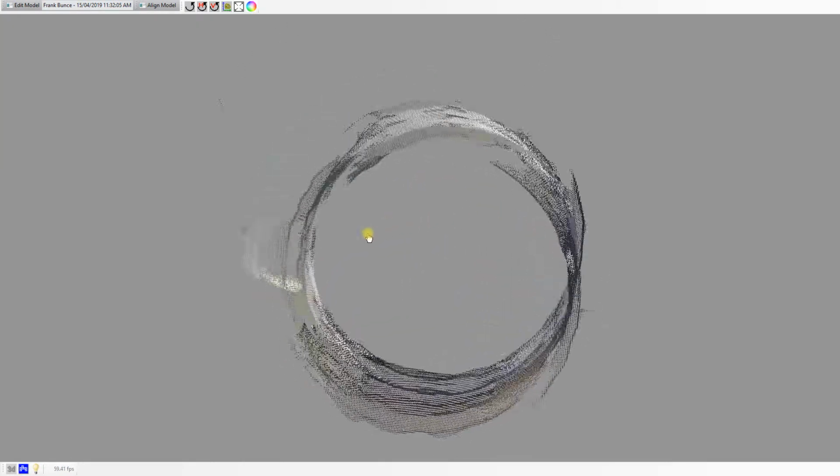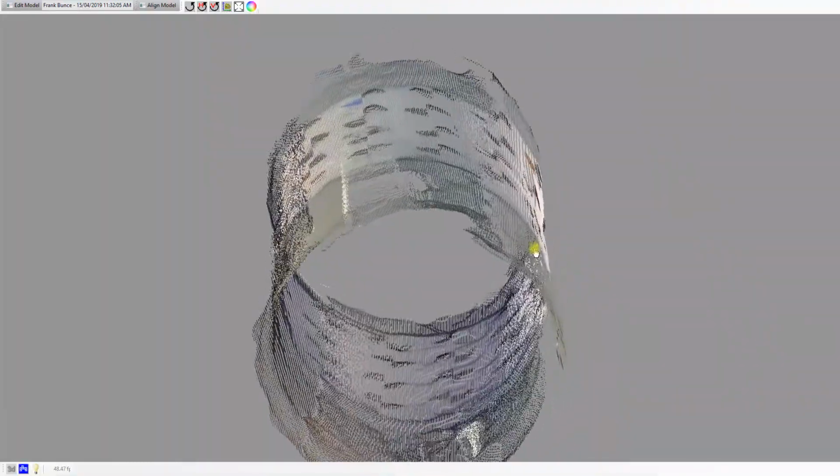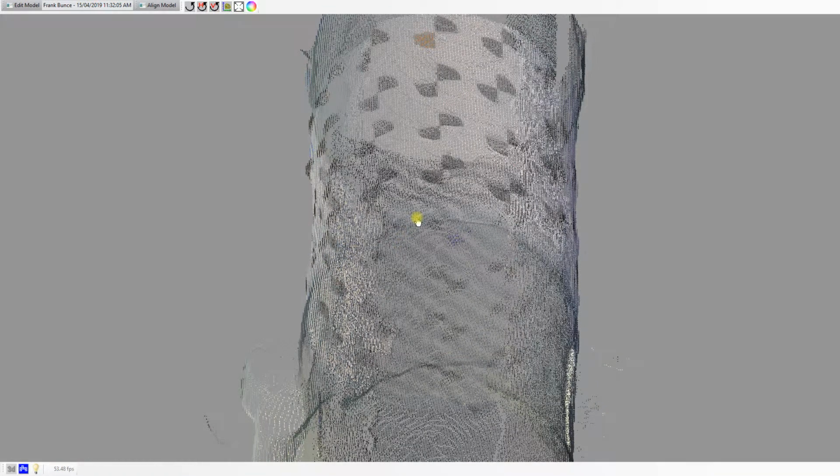which brings back the colors. Now you'll see that this is all mesh-like. That's perfectly fine. Don't interpret that as poor imaging. It's not. It's actually now a 3D model. It's not a photograph that you're looking at at all. Every single thing on here is a point, a documented, identifiable point. We know where it is in real time and real space. By that I mean, you could say that this point here has a coordinate of X number, Y number, and Z number, and a time.